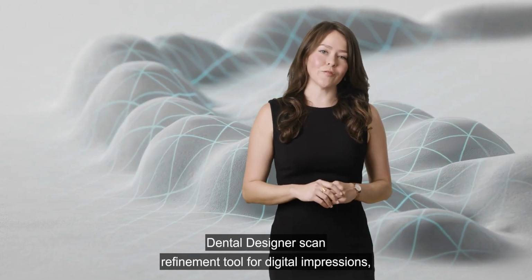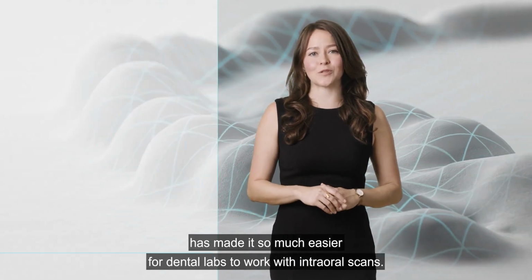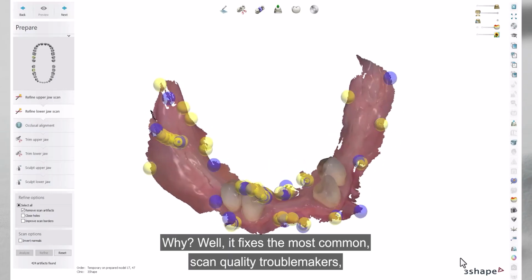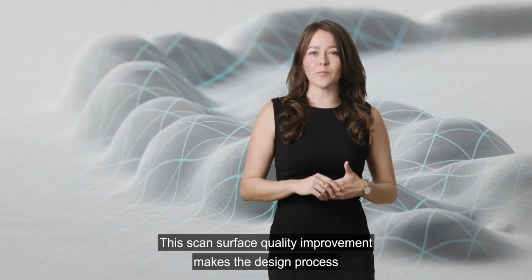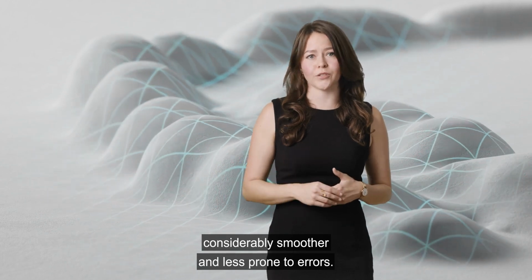Dental Designer's scan refinement tool for digital impressions has made it so much easier for dental labs to work with intraoral scans. Why? Well, it fixes the most common scan quality troublemakers, as we call them, such as artifacts, flying islands, and small holes. This scan surface quality improvement makes the design process considerably smoother and less prone to errors.